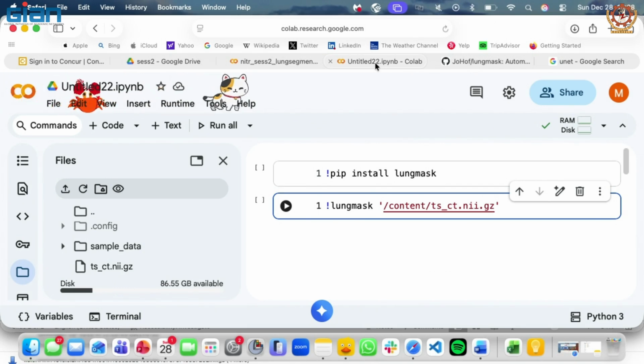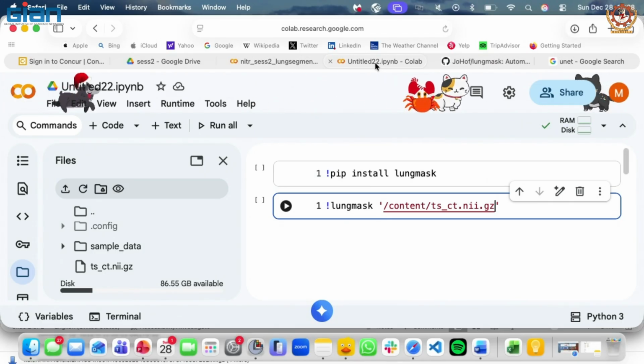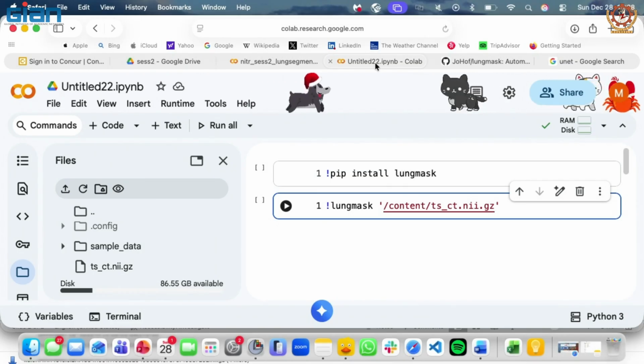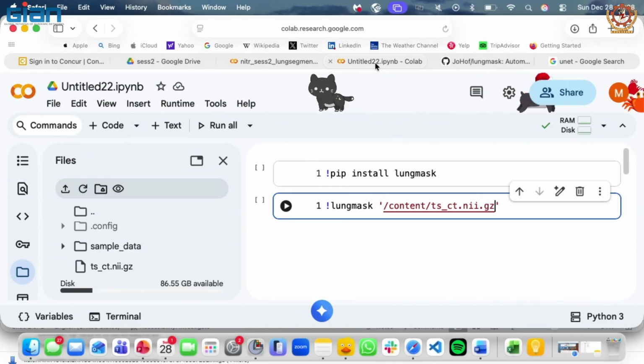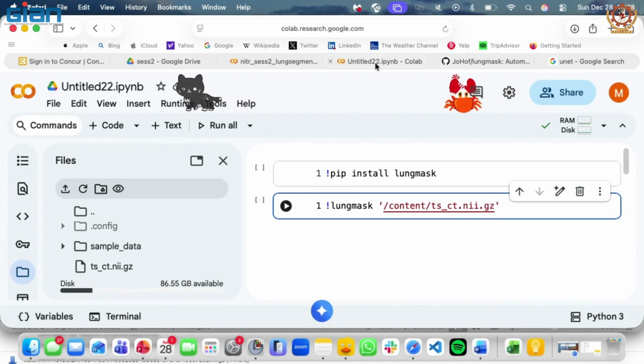If it says command not found, just rerun. Or the spelling is wrong. The problem with pip libraries is, if you make a spelling mistake, there may be another library with that same misspelling, and you will think it downloaded accurately and it's not a problem, but then your actual code does not work.